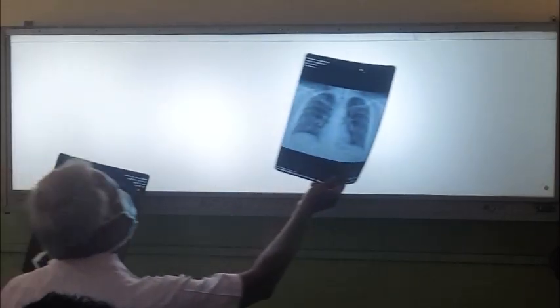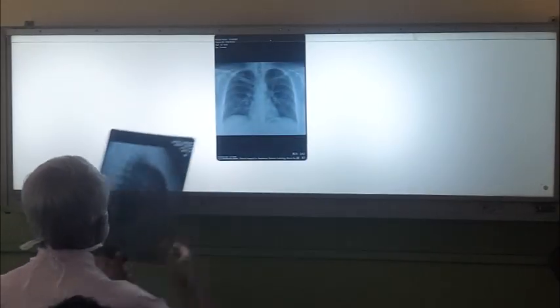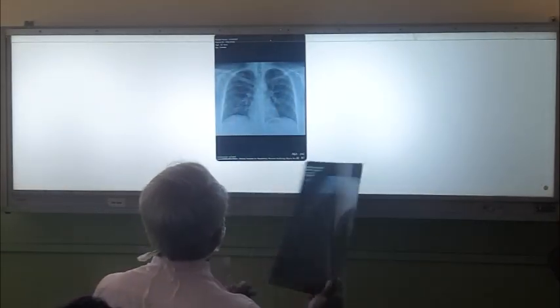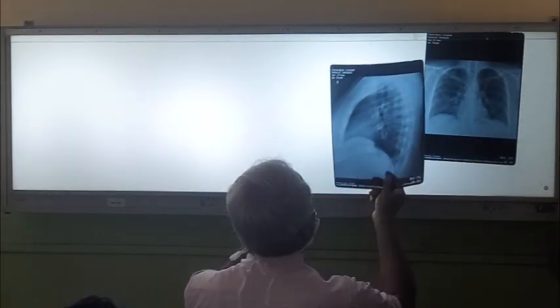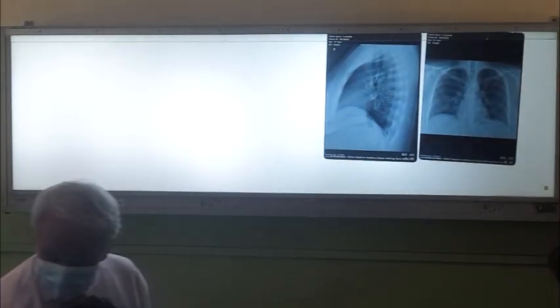Just listening, right? Just listening, because I'm not a radiologist. I'm just going through some X-rays. So I'll show you some X-rays, and after that, when you see an X-ray, just try to describe it the way that I'm going through these X-rays. Okay.